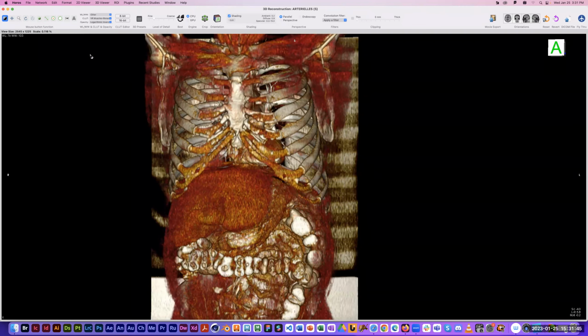That little grayscale tool that I was just using to change the transparency is called the window level tool, and window level is really referring to the opacity or transparency of different tissues. This and window width, I'll explain what those two terms mean in a minute when we can actually see it visually. But there are presets for these things. So there are presets for window level and window width.